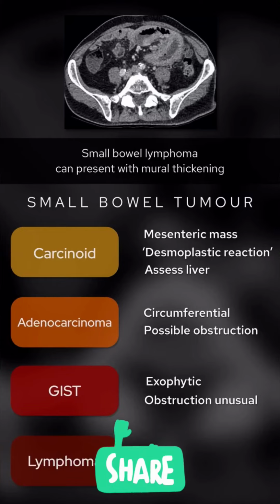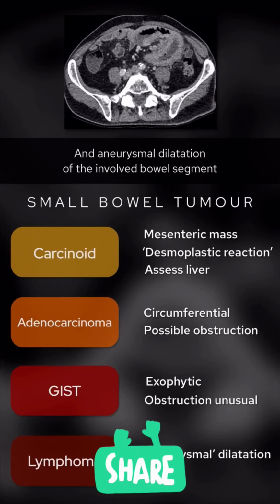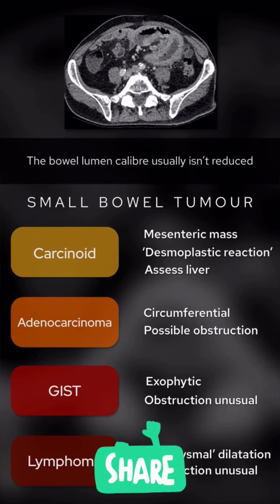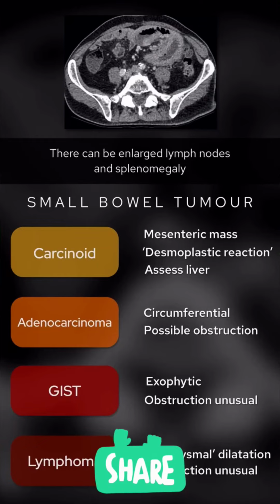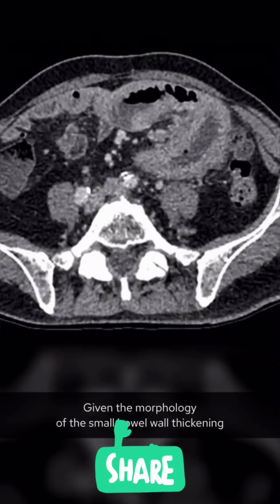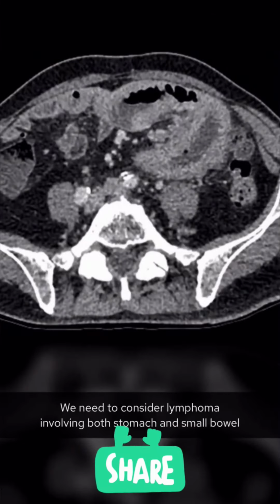Small bowel lymphoma can present with mural thickening and aneurysmal dilatation of the involved bowel segment. Obstruction isn't common, as like large bowel lymphoma, the bowel lumen calibre usually isn't reduced. There can be enlarged lymph nodes and splenomegaly. Given the morphology of the small bowel thickening, we need to consider lymphoma involving both stomach and small bowel.